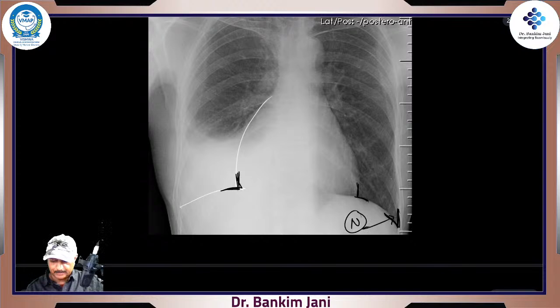This is normal. Yeah, so much fluid, exactly. And over here, see this? This angle is totally obliterated, and you can see this is the fluid level, the air fluid level. So this is a very advanced stage, but this is how it looks.